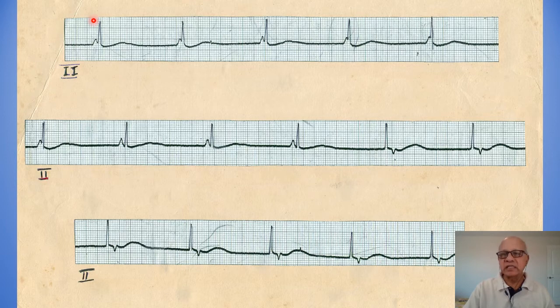Now this is the ECG of a 75-year-old man who came with a history of recurrent episodes of giddiness and an occasional blackout. ECG in a single strip. This is a single strip actually. From top to bottom, it is a single strip cut into 3 pieces. So all 3 panels are continuous with one another. That you have to remember. And it is lead 2 as we have shown here.